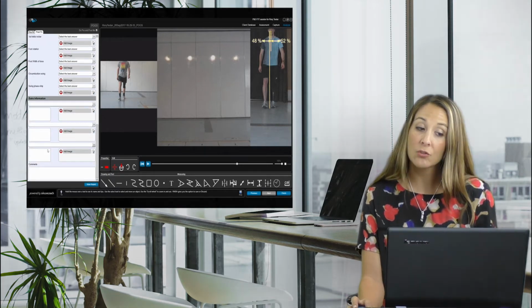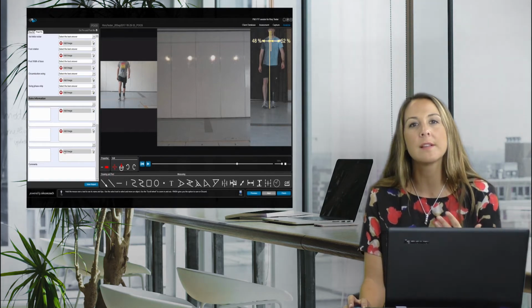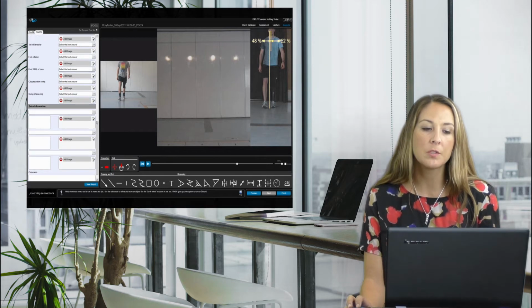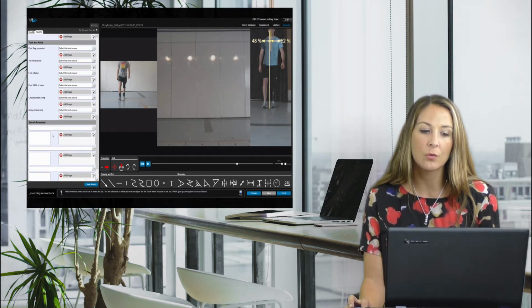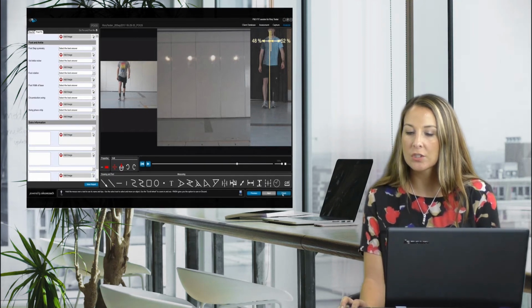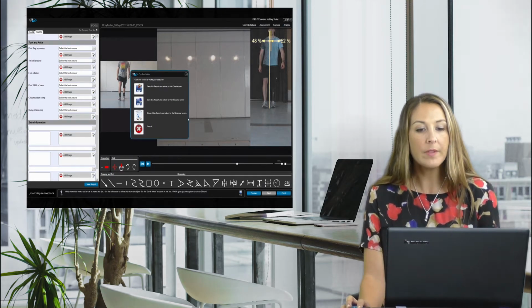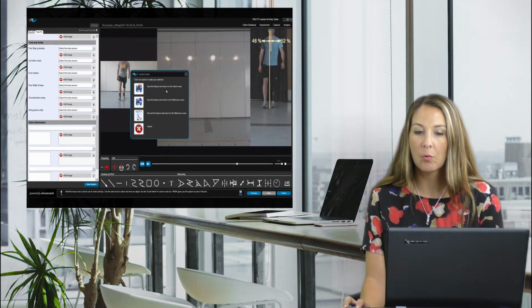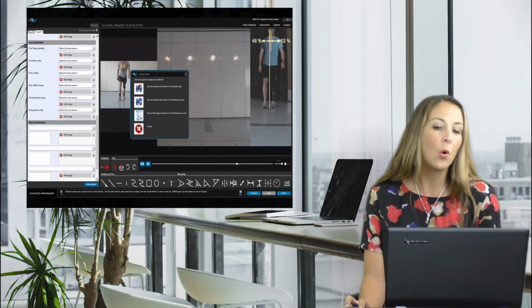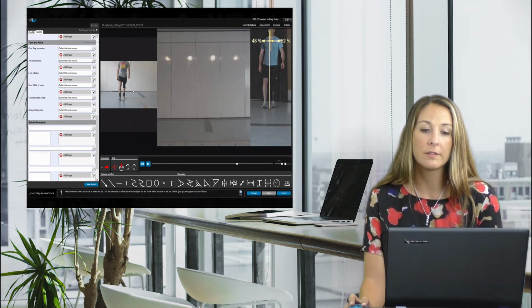We've got extra information as well. The web-based software template allows you to add extra information, making some observations free form and adding those to your report. So I'll go ahead and click finish so that we can see what this report would look like. So the database allows me to save the report and return to the client area, save it and return to the welcome screen, or just discard it. But I will definitely save it and return to the client area.